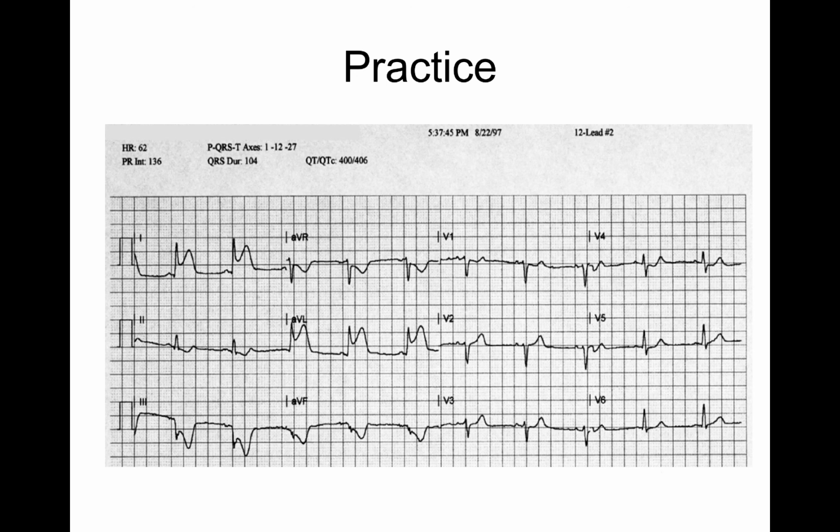Okay, now this is also a good one. We have 2, 3, AVF. So we're looking for ST elevation, okay? ST changes. I have ST depression here. Profound ST depression. Profound ST depression here too. So that is ischemia going on in the inferior portion.